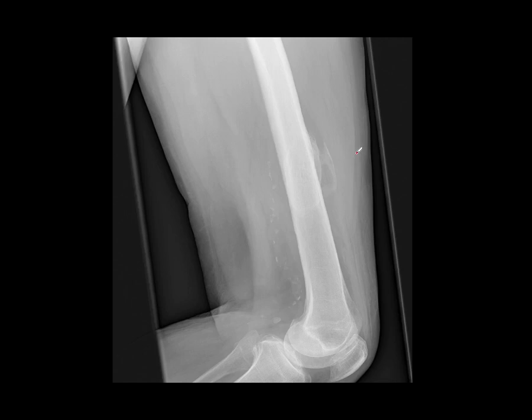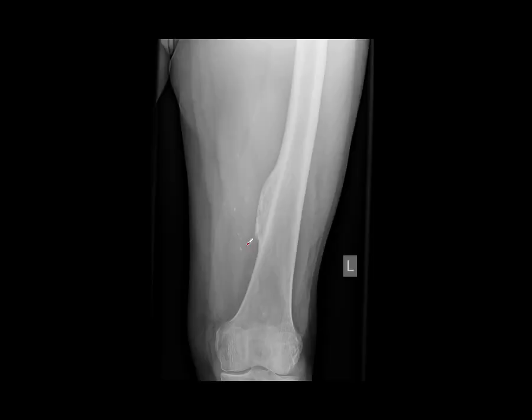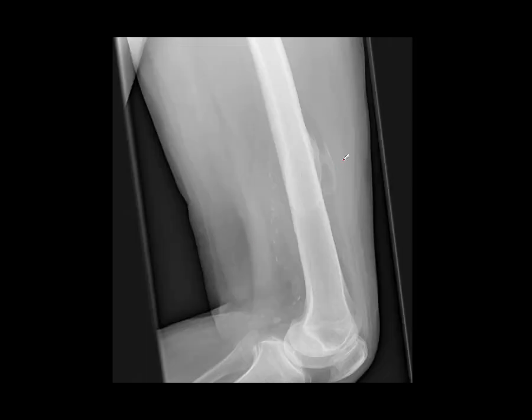But in this case, this patient was just having a scan for prostate cancer, and it really wasn't very active at all. So that's myositis ossificans, mature periosteal reaction. Don't confuse it with osteosarcoma, and you might be asked to do a bone scintigram to see if it's active or not, and report back to the surgeon to inform the timing of any surgery to remove painful myositis ossificans.